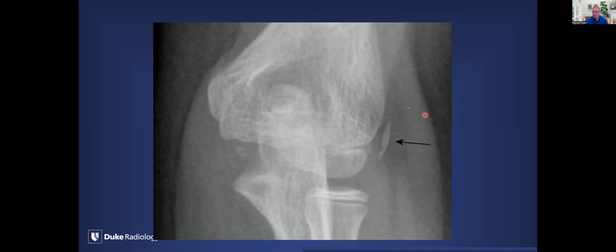Okay, keeping with the theme from the original pisiform image, again, we have these secondary ossification centers all over the place. There's multiple about the elbow. One of the things we have to come to understand is that, again, there's a lot of cartilage that goes on to mineralize. Unfortunately, it doesn't mineralize in a uniform fashion, so we get some irregular mineralization. But this is the lateral epicondylar ossification center, cartilage around it. So this is normal. It can look like it's potentially displaced or separate from the lateral condyle of the distal humerus.